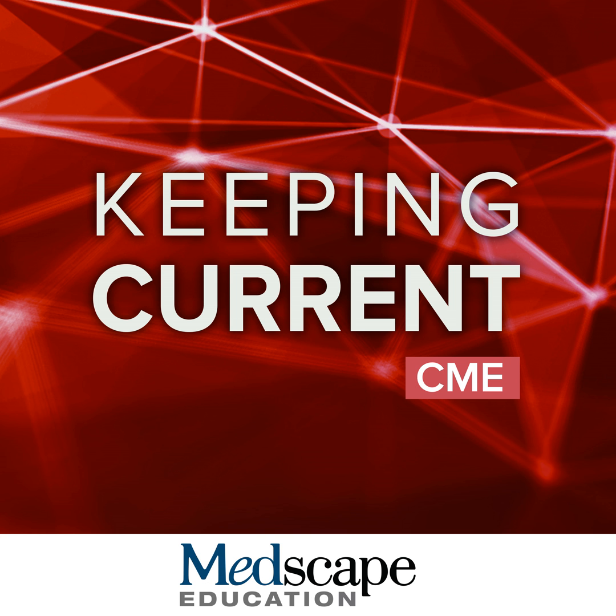So it turned out that there was a chronic MI inferior wall as shown on MRI, but also an acute anterolateral wall infarct with edema and no reflow zone. This had been missed on a cardiac catheterization, but review of the cardiac catheterization revealed that there was an occluded small obtuse marginal branch. So again, it illustrates the importance of MR and how this can really be used to characterize disease.